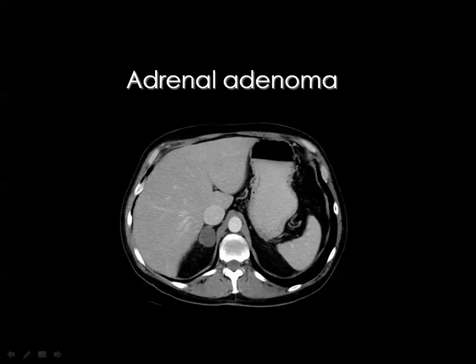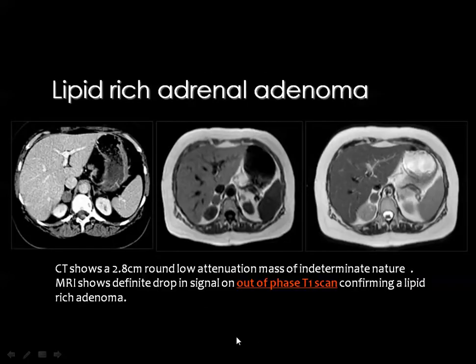But which is very important is the washout of the contrast seen in the delayed scans taken 10 minutes after contrast injection. And you see here the CT scan of a suprarenal adenoma on the right side showing a relative hypodensity.